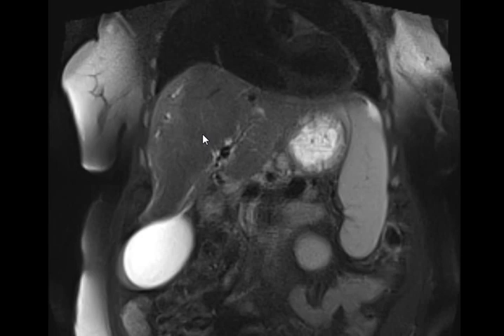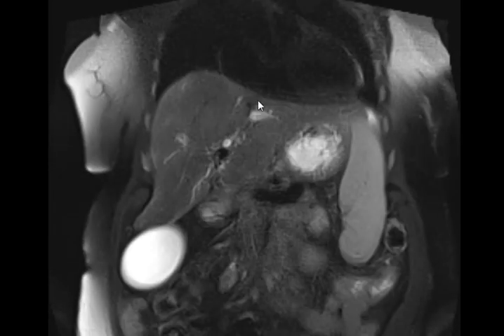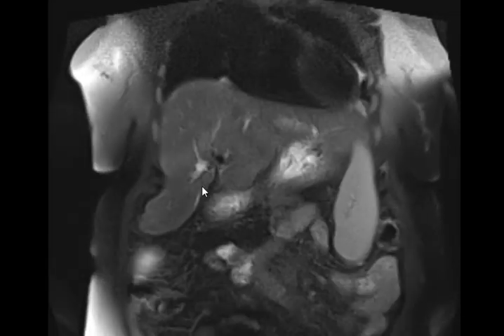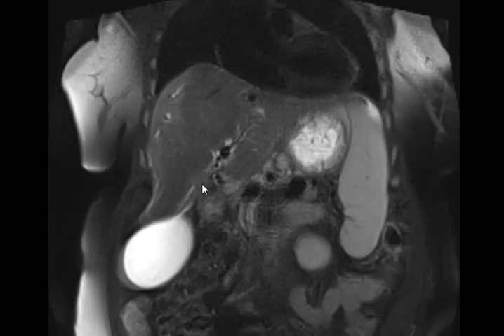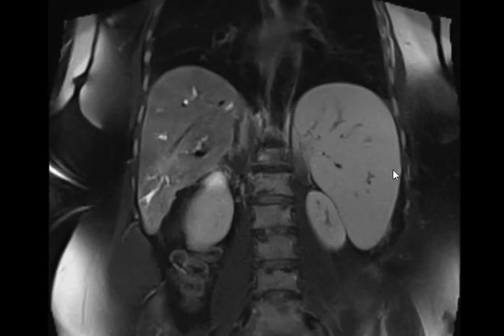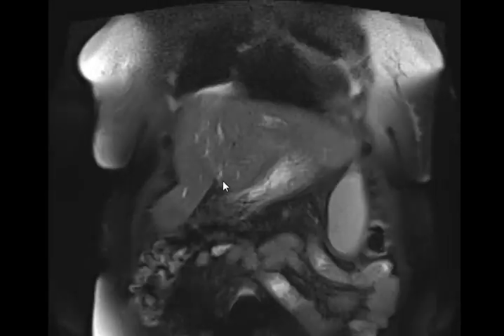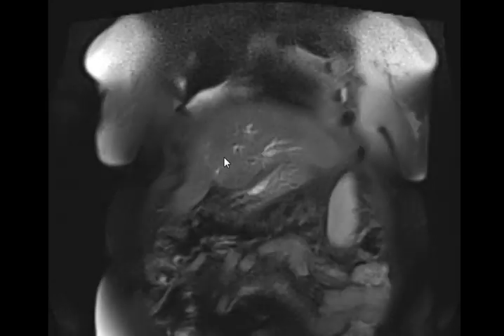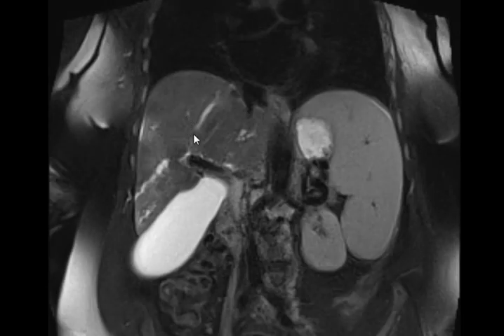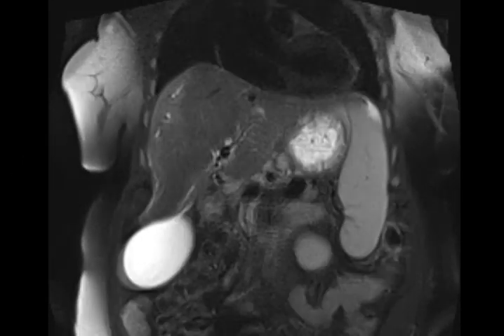Heterogeneous. Okay. So cirrhotic or not? No typical features. Not typically cirrhotic. It has nodularity. No nodularity, no. Okay. Is it enlarged? Is there hepatomegaly? Splenomegaly. There is splenomegaly. Excellent. I was waiting for you to say that. There is splenomegaly, definitely. What about the liver? There's dilatation of the intrahepatic biliary duct. Okay. Go to other sequences.